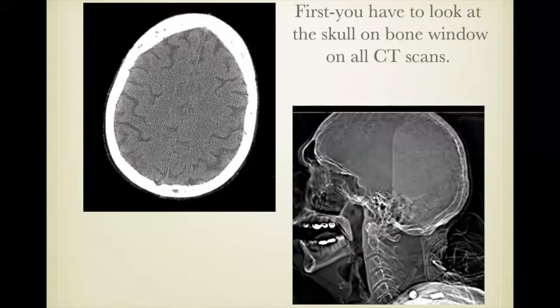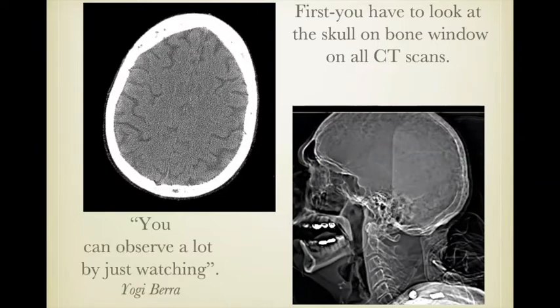So to start, make sure that's part of your search pattern to stop and look at the skull images that are provided and make sure you're looking at them in an appropriate window. As Yogi Berra said, you can observe a lot by just watching.